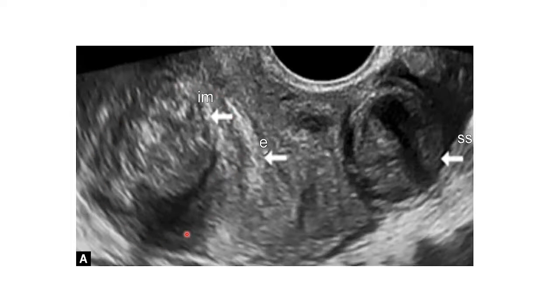So you must learn to appreciate and understand anatomy using different machines, because some machines have got a very good resolution, but some they don't have so good resolution. So you must be conversant using high-end machines and using the old machines, so that if you switch departments, you can still be competent in using these old machines.